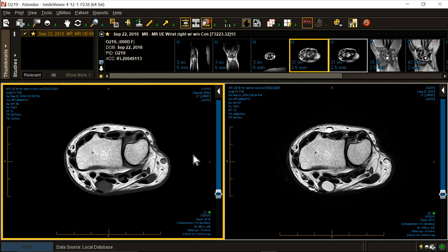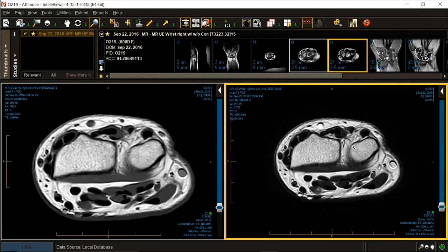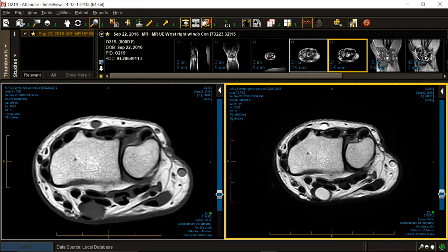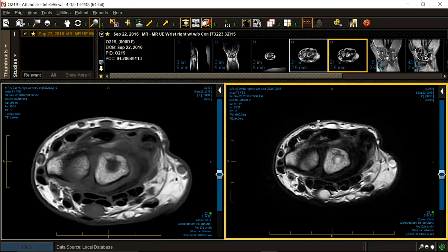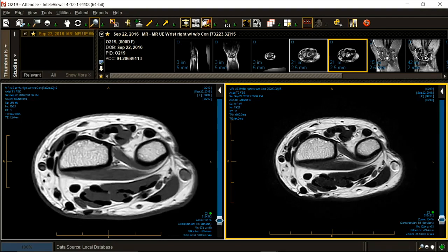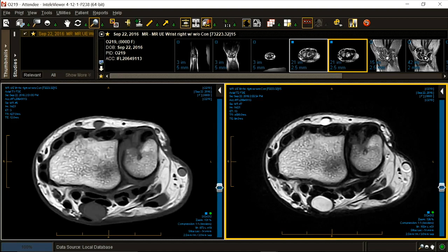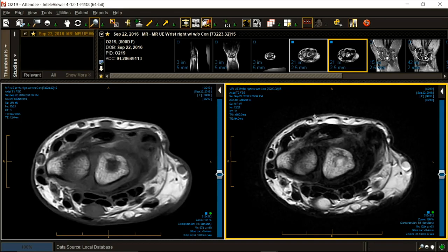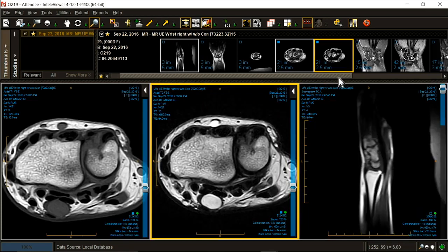There are a number of extraneous interesting findings, like swelling of the dorsal radial ulnar ligament. It's not what we were asked to pursue. Take your time. It's an obvious mass. I'm going to put up one long axis.